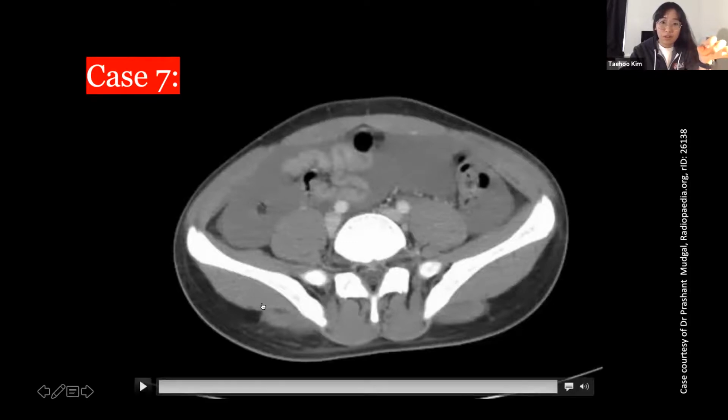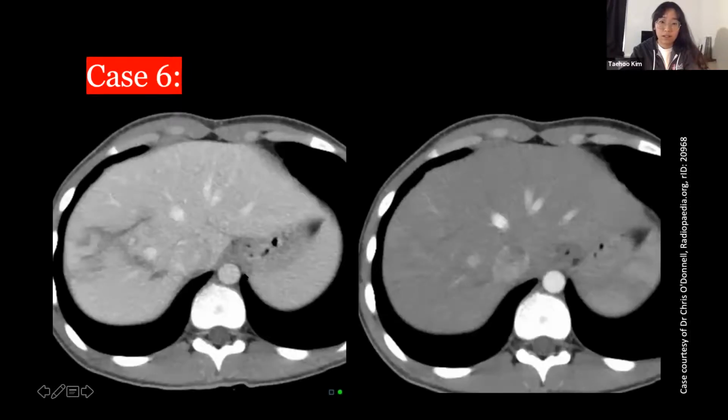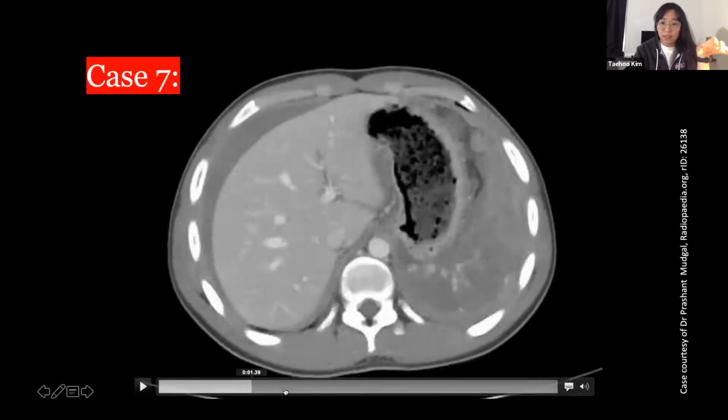Also, like you always look at the aorta. If the organs are not well enhanced like this one, but the vessel is, then that's the arterial phase and that's the portovenous. Like us, we are trained to look at everything. There's not a right order, but we suggest in trauma cases, you start with the arterial phase and portovenous side by side, and look if there is anything that's extravasating, like in this case.